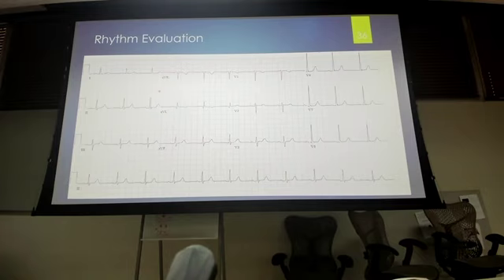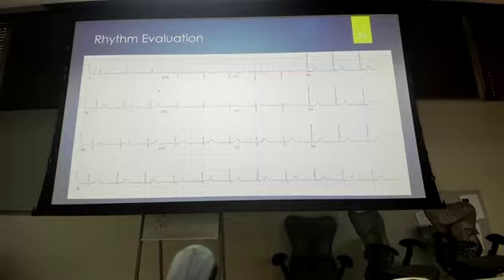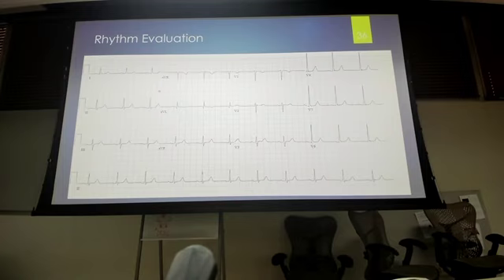So one of the things about using the 10-second method, let's say we had 20 R waves across. Oh, you only know it's 20 because I told you 20. Otherwise, you've got to count. It takes a long time. If you just did the 300 counting method, 300, 150, 100, 75, 60, you're done. The majority of the time when I do it, I just use the counting method because I train myself to use counting. It's much easier for me.